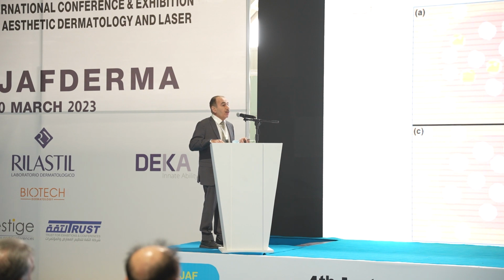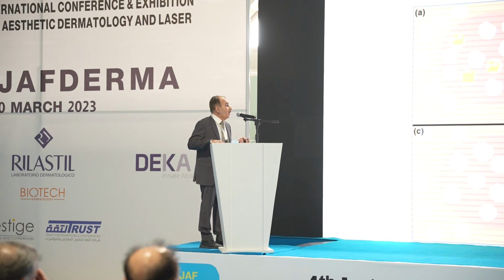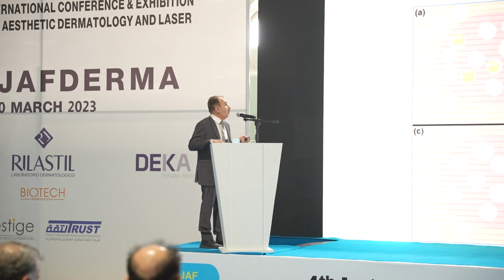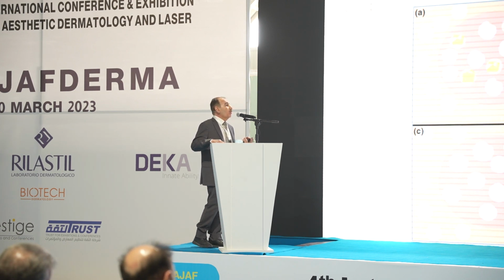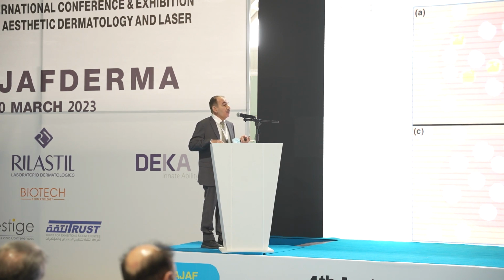Folliculars, we look at the follicular openings, and there are certain characteristic findings. The picture on the A shows us follicular plugging, like that we see in discoid lupus erythematosus, while B, the follicular hemorrhage or red dots.